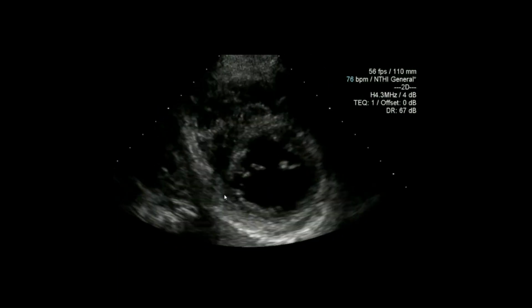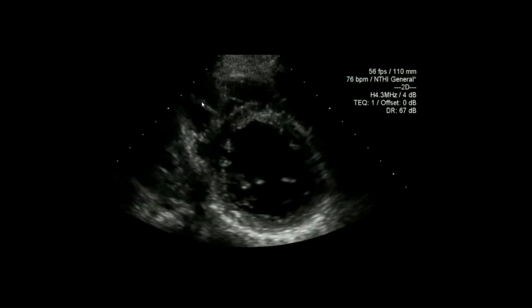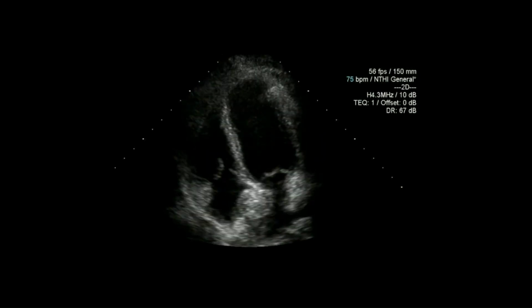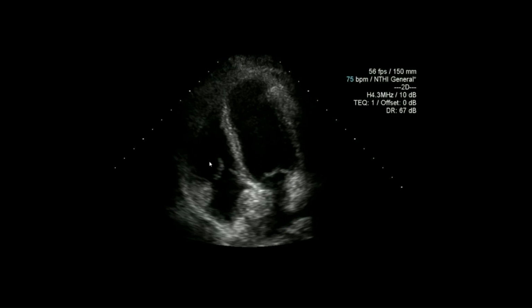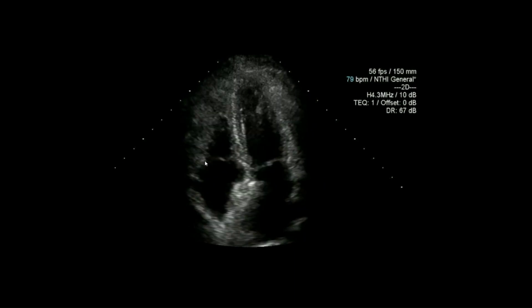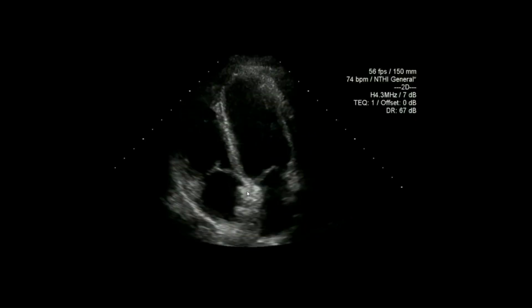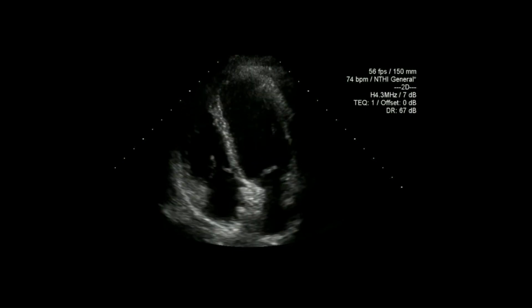Looking in the short axis, we've lost that D-shaped septal flattening I was referring to before, and the right ventricular size as it curves around the left ventricle in this view does not look particularly dilated at all. And now when we come down to the four-chamber view, yes, we can see the device clearly there, but the size of that right ventricle in comparison is dramatically reduced and normalized. And so if we measure that diameter across there, we'd see very quickly, compared to the size we had before, it has significantly reduced. Given we had about 5.5 centimeters, now it's quite within that normal range.